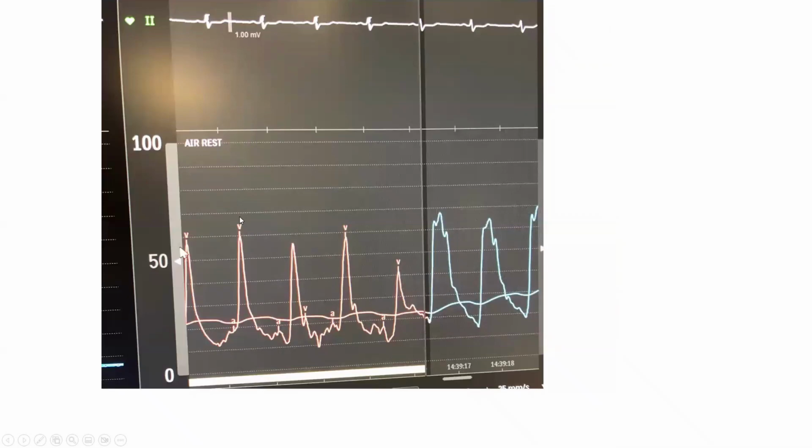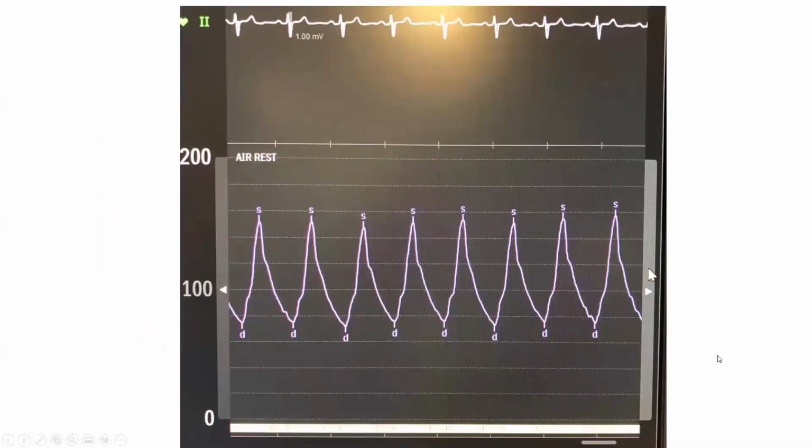And this is, in this patient, the wedge pressure versus the PA. Again, look at the PA. It's wide and it's peaked throughout the systole. It has a sharp upslope and slower downslope, versus a peaky V wave in a wedge pressure with a sharp downslope.